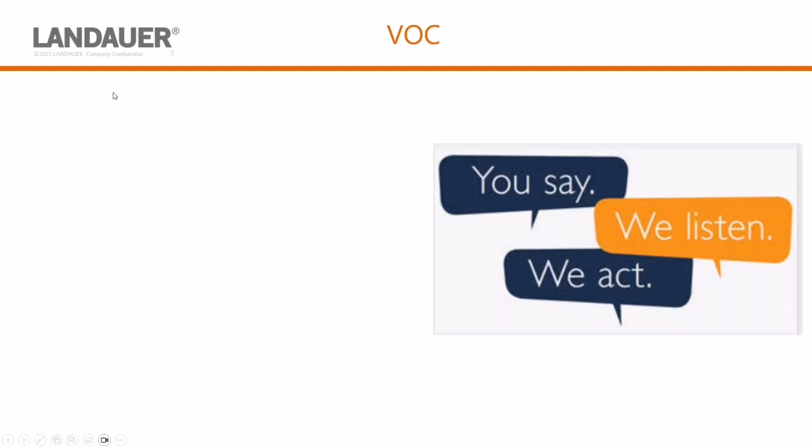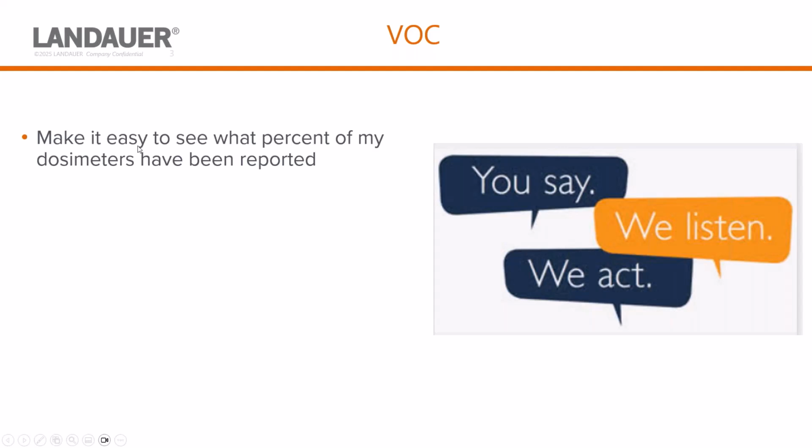one area was really around RadFacts, and what we heard from customers was, number one, make it easy to see what percentage of my dosimeters have been reported. Historically, it's been kind of a wait and see period to look and make sure all of my dosimeters are in so that my data is valid. So we've added some functionality here. Also, to help me drill down around fetal dose, we've added functionality here because we really wanted to make it easy to get to that fetal dose.